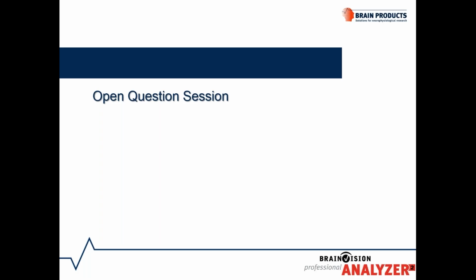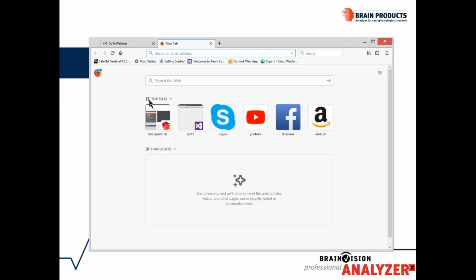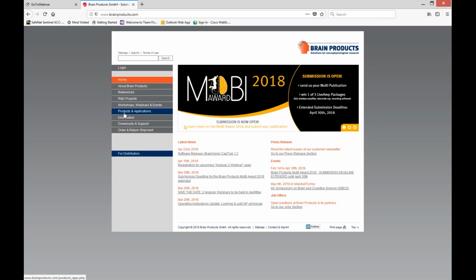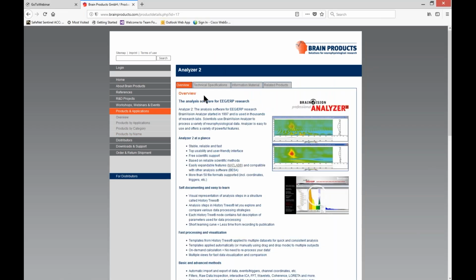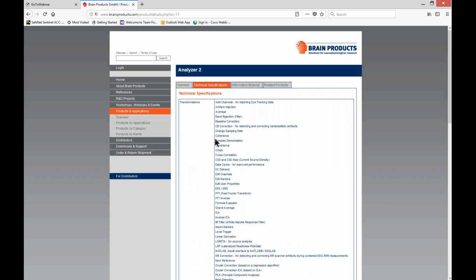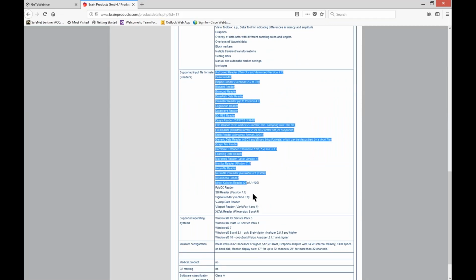For that, let me show you our website. Here we go. Go to products, find Analyzer by name. And under technical specifications, you can check out all the transformations, views, and here you have a list of all the data formats, all the readers which are implemented.